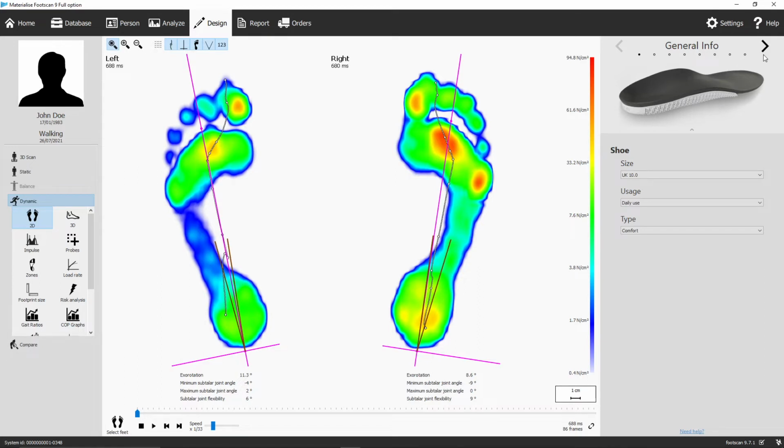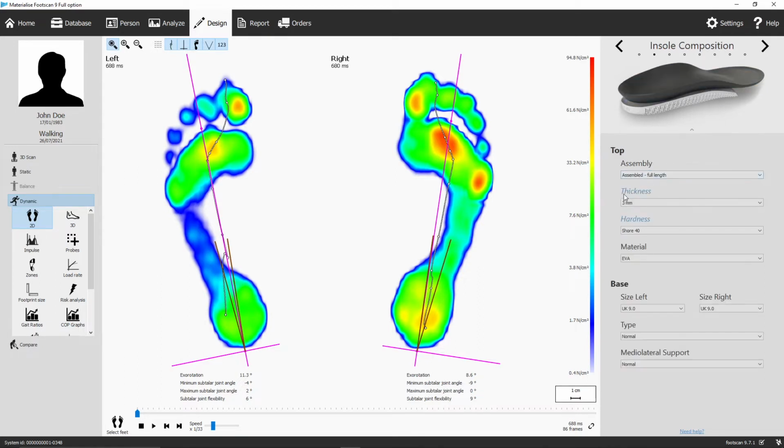These calculations can be recognized in the software by the blue and italic title of the correction, whereas modifications that are not suggested have a black label. A suggested correction can, of course, still be adjusted. When you do, the title will become black.